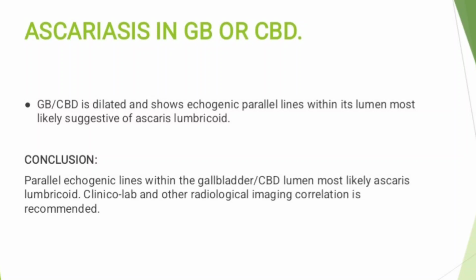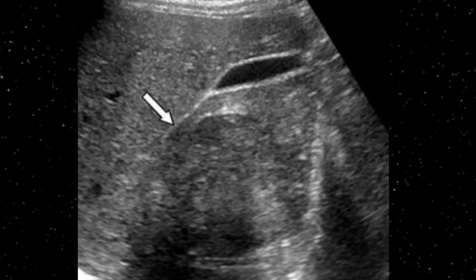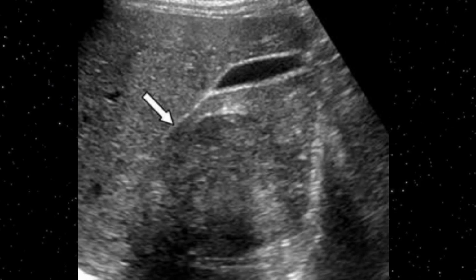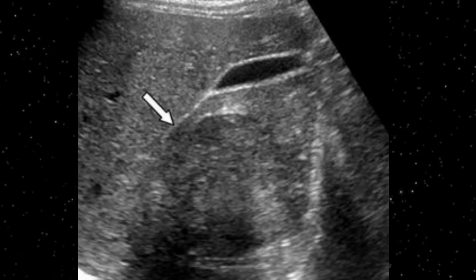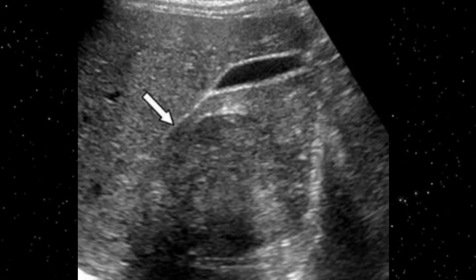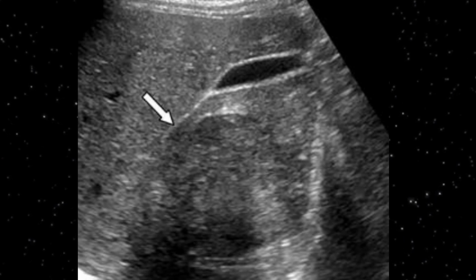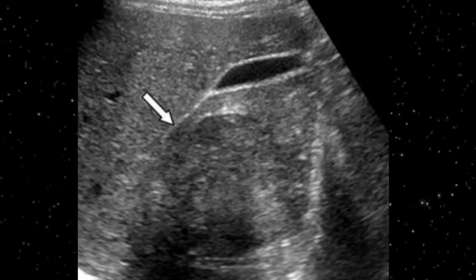So therefore further imaging must be advised on the report. This is another image, a bit tricky, because you can appreciate a well-defined large hypoechoic, to some extent hypoechoic mass with a clear boundary within the right lobe of the liver. So you have to look for the size, you have to mention the echogenicity of the lesion, and you have also document on the boundary as well.